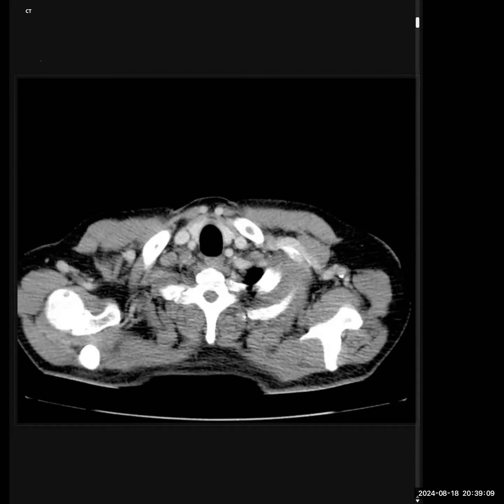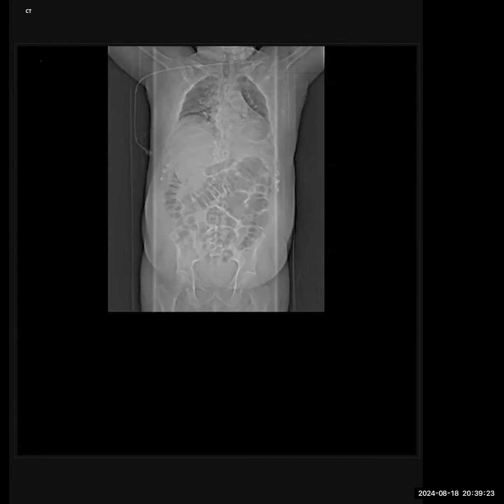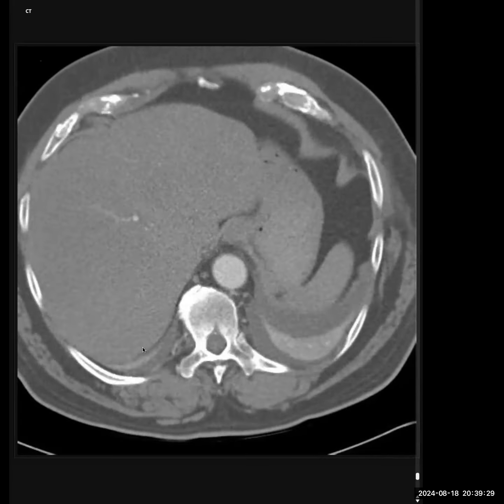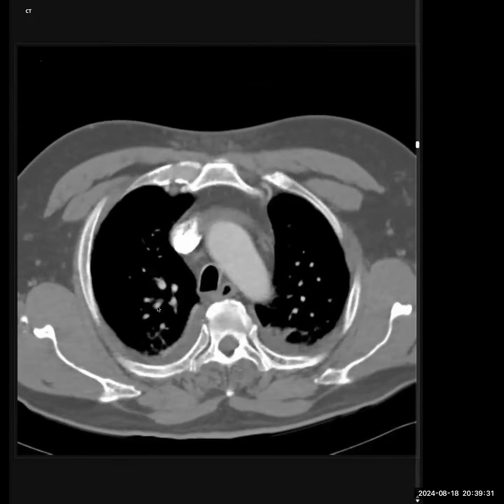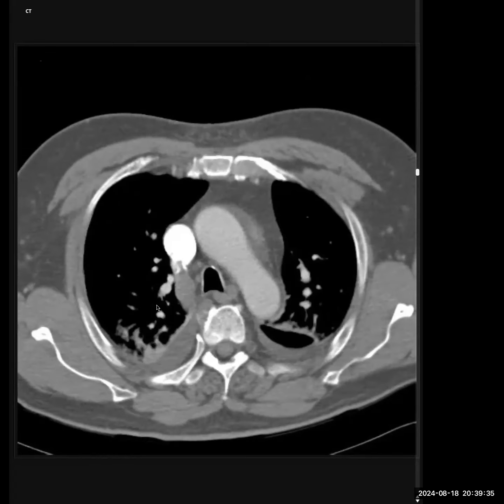This was the first case. This was the second case. You got it straight away. This is an aspiration of a tooth in the left, I think, lower lobe of the bronchus, causing consolidation. I didn't take you through the CT, but the CT went on to confirm that, causing this kind of bilateral consolidation. This patient also had some small PEs, but I wanted to take you through some other cases.